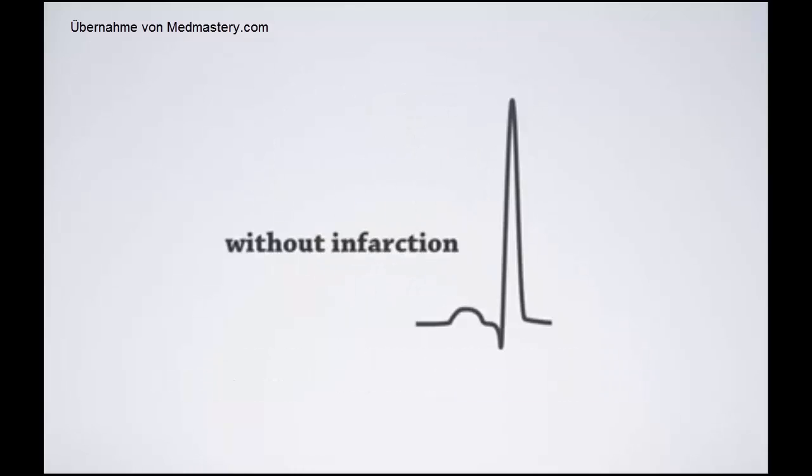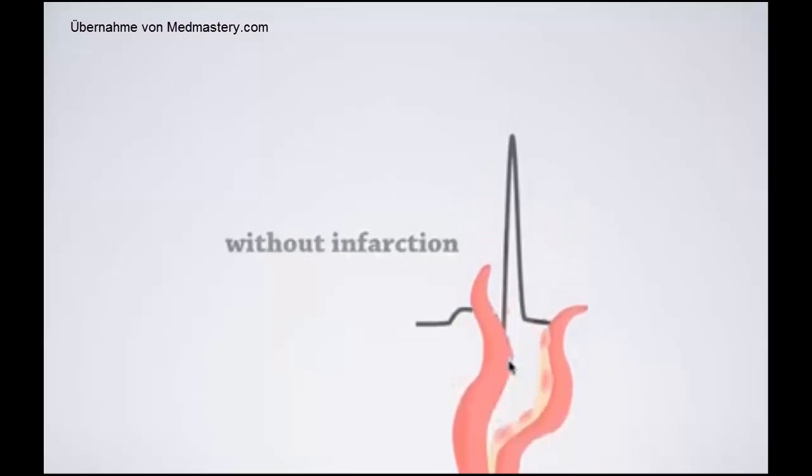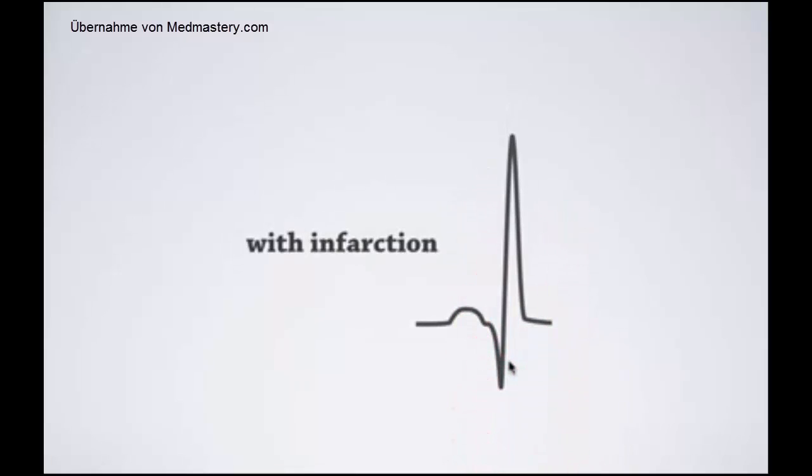Now let's check out some examples of how the QRS complex morphology changes in the setting of myocardial infarction. In this example, there's an initial Q wave, which you can see right here, even without myocardial infarction. This could be lead V5 or V6, where we would typically see a small Q wave in normal patients. And when myocardial infarction or scar tissue develops underneath that lead, the whole complex gets pulled downward. So the pre-existing Q wave gets much bigger than before and is now 1/3 the size of the R wave.